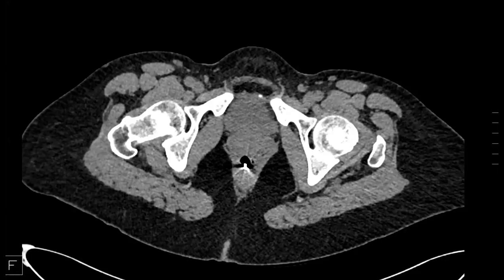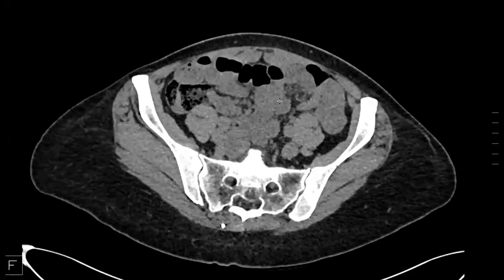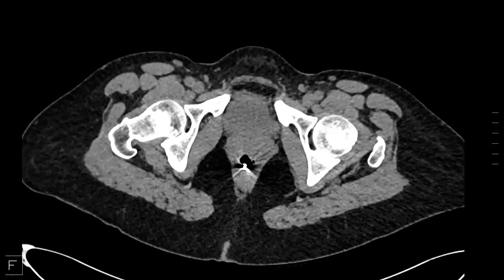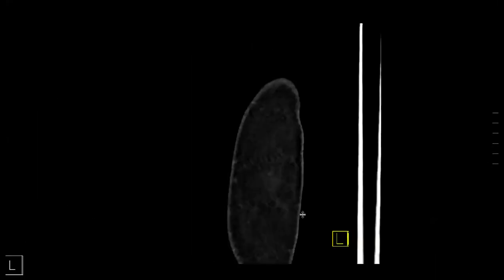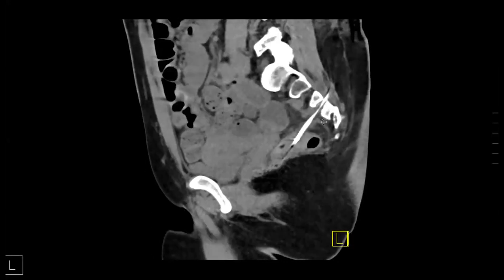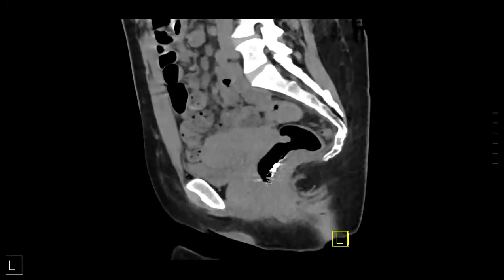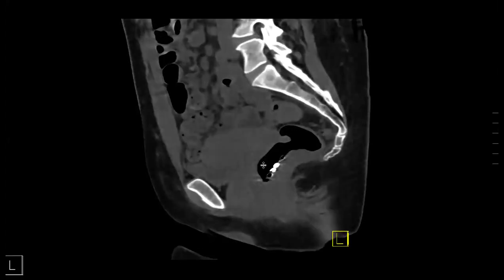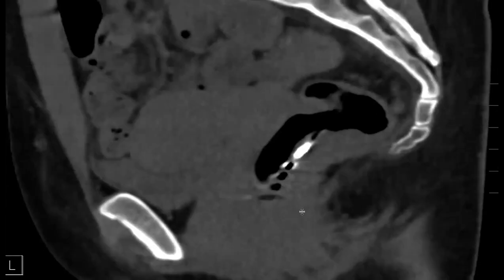Here's my second case. This came for a second, third opinion on an InterStim that was placed elsewhere, and this is what it looked like, within the rectum. The discussion was really informative for me. This was a pretty deep placement, and it's malpositioned in the rectum. What was informative for me was the surgical approach to fix this.